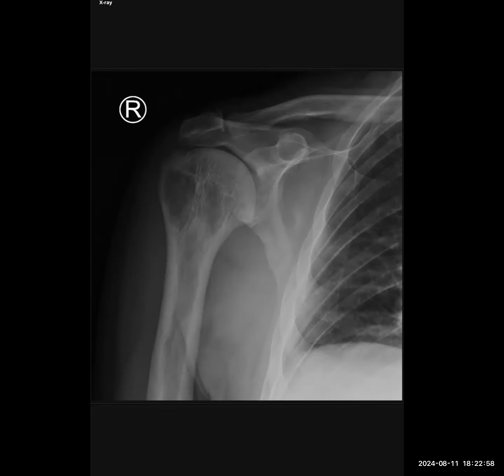So, in this patient with a well-defined lytic area in the humerus with cortical thickening and increased trabeculations, I would like to correlate with the age of the patient. If it is more than 50 years old, I would be thinking it could be a case of Paget's disease.